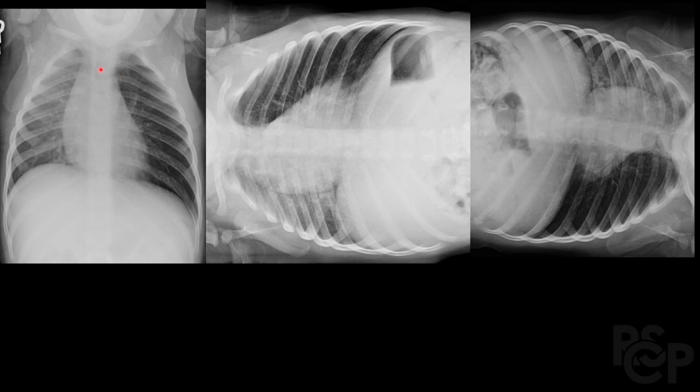So this is a 1-year-old patient presenting with respiratory distress, and we start off by looking at the upright x-ray that they got, and we notice how this side is a little more hyperinflated than this side. So there's a left hyperinflation compared to the right. We don't notice any pneumothoraces on either side. We don't notice any pleural effusion. Everything else appears to be pretty okay.